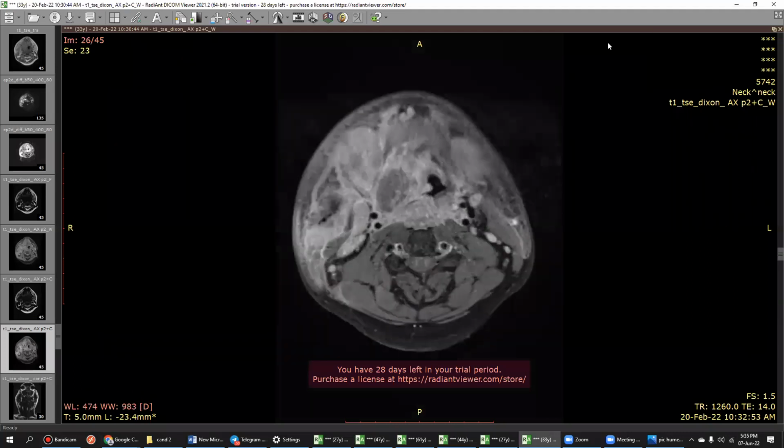Any cases which we have to discuss? Any case which we didn't discuss? Nothing, right? We have done the osteomyelitis and multiple myeloma, right? You are seeing the bone lesions. Why were you thinking like that, when the bone lesions were not very clear? Yes, there were lytic lesions and osteopenia.